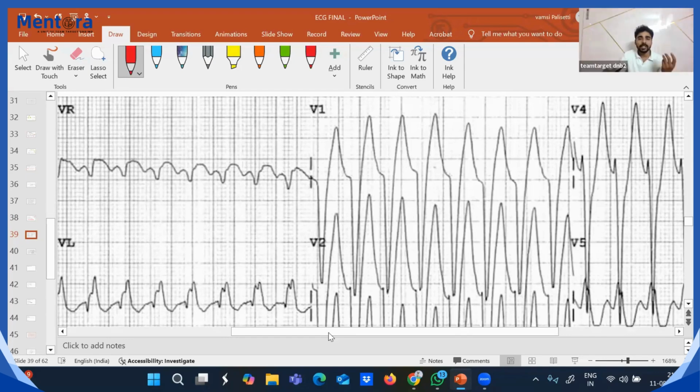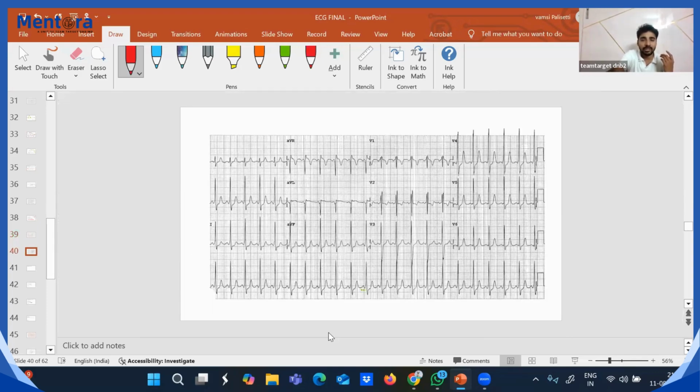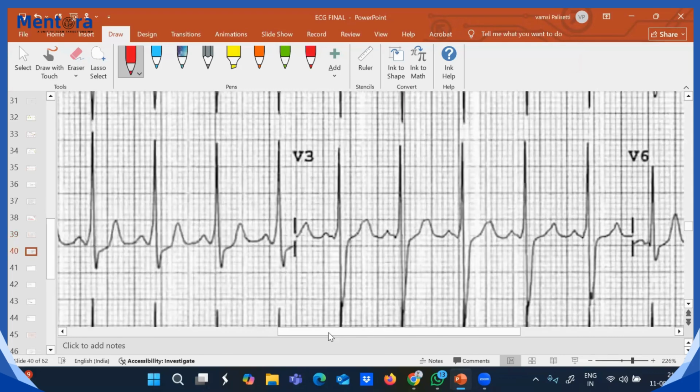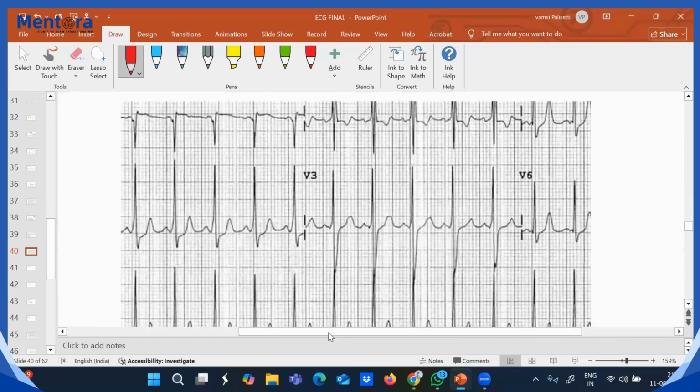So treat like a VT. After treating, the rate is controlled. Then you see the ECG, and the ECG is showing this. Yes, delta wave is there. So it's simple. Like that only you have to diagnose. Otherwise you cannot diagnose by saying, I will apply my mind, I will say antidromic AVRT. We cannot do that, because the patient will die. VT we cannot miss. The patient won't get any time. Okay? Clear? Yes, sir. I think I am clear.